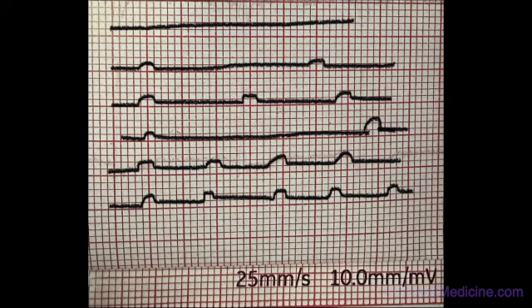The sinus node can stop firing the electrical activity, and there may be a flat line for a prolonged period, which is called sinus arrest. On the other hand, this may be transient, and the SA node can stop firing and resume firing. If this is a short interval, say 1 to 2 seconds, it is called sinus pause.